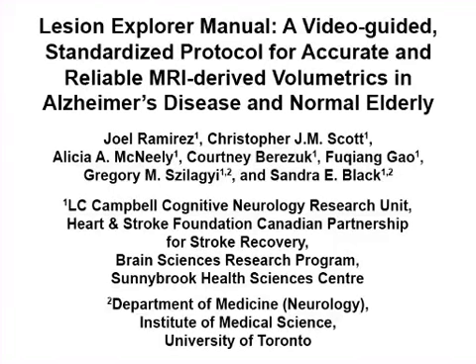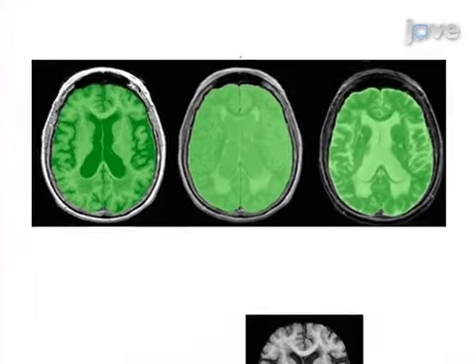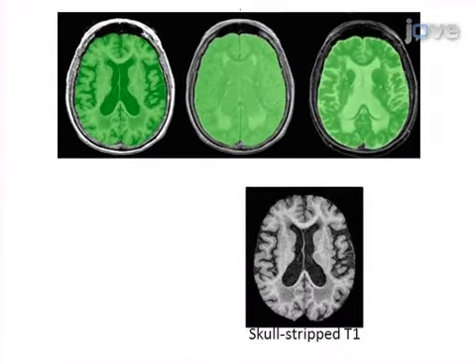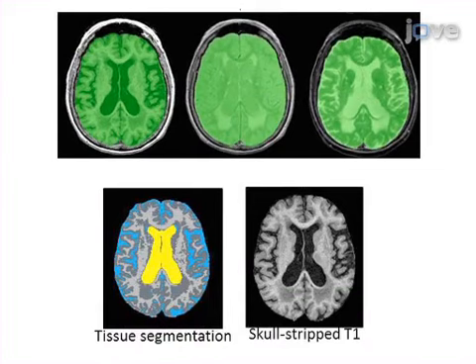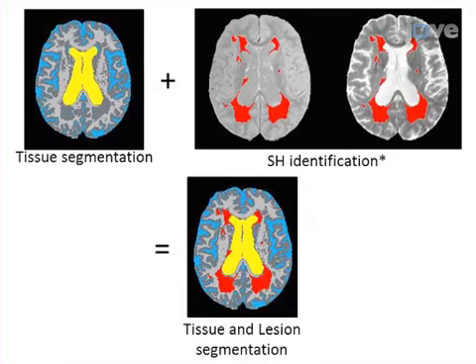The overall goal of the following pipeline is to better understand aging and dementia by obtaining MRI-derived measures of regional brain atrophy and neuroimaging biomarkers of small vessel disease. This is achieved by first generating a skull-stripped brain mask and a basic brain tissue segmentation to accurately quantify the total intracranial volumes. As a second step, a tri-feature lesion segmentation is completed to quantify and classify lesion subtypes for accurate imaging biomarker measurements of small vessel disease.